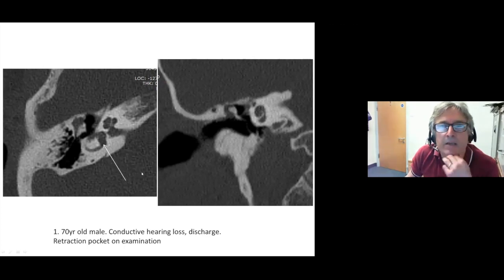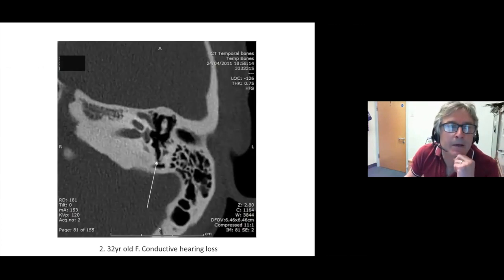It's the great thing not having any feedback: I can say whatever I like, and it may all just be complete rubbish, but I can decide. So case number 2, diagnosis.